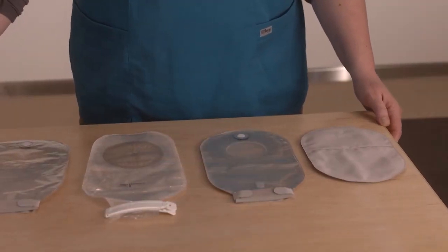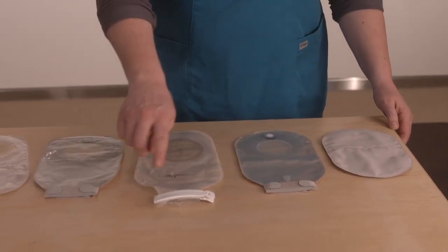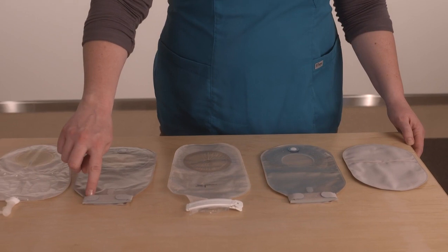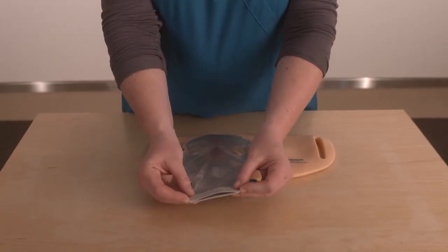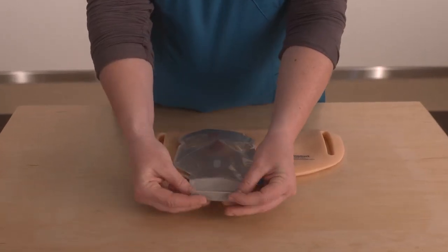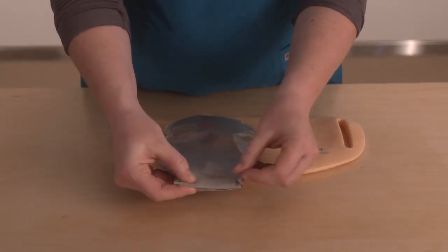Ostomy pouches may be closed-end or drainable. Types of drainable closures are clamp closure, integrated closure, and small spout outlets designed for urine. The outlet is used for emptying the pouch without removing it. After emptying, the outlet is closed and the pouch is ready for further use.